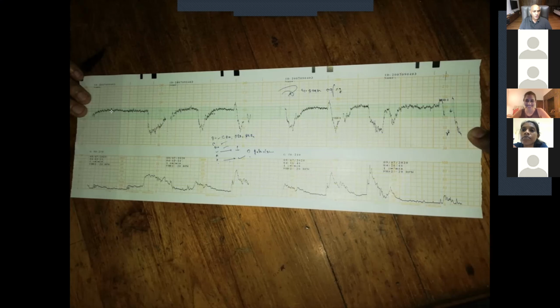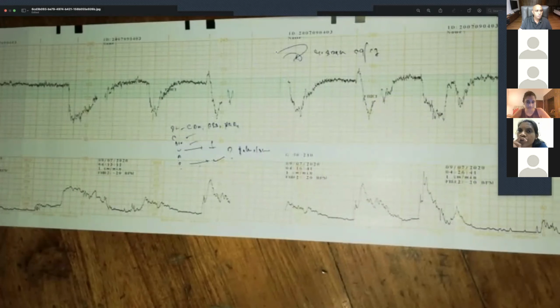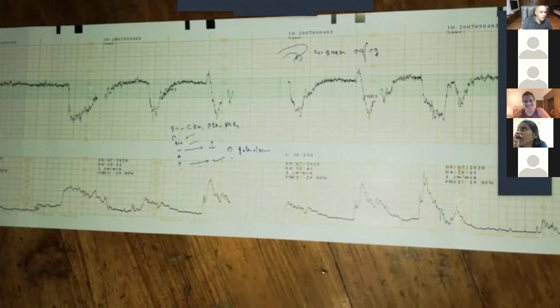Right. Look, children, if you look at this CTG, now this is the baseline. Can you see that? Anything between two decelerations is the baseline. Can you see this baseline now? The baseline is at, we'll make it bigger. So the baseline is at 140. Can you see that? Right? So is it reassuring? Yes. So that feature is reassuring.